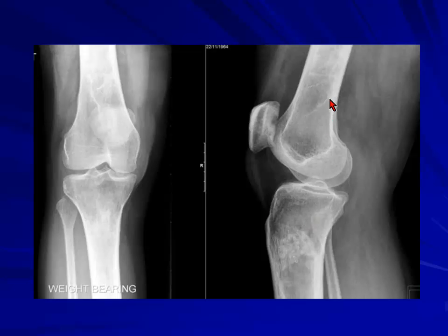So how will you describe this? This is where it is. You have got it at both distal ends and the proximal end of the bones. These are the metaphyseal-diaphyseal junction. This is the diaphysis, and the expanded part is the metaphysis. So at the junction here and at the junction here, the metaphysis is fine. You have got it at this junction.